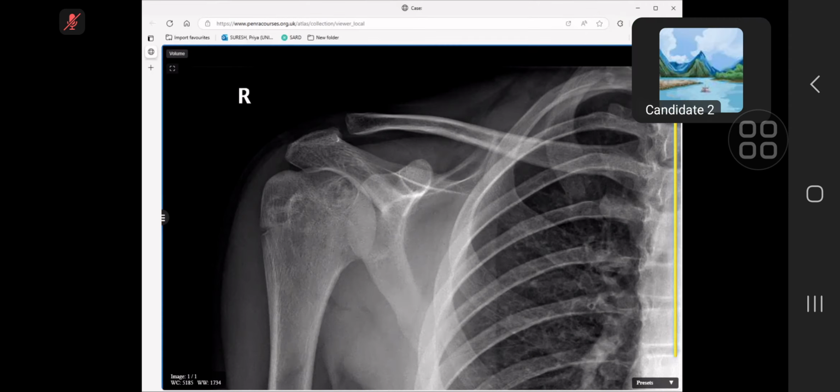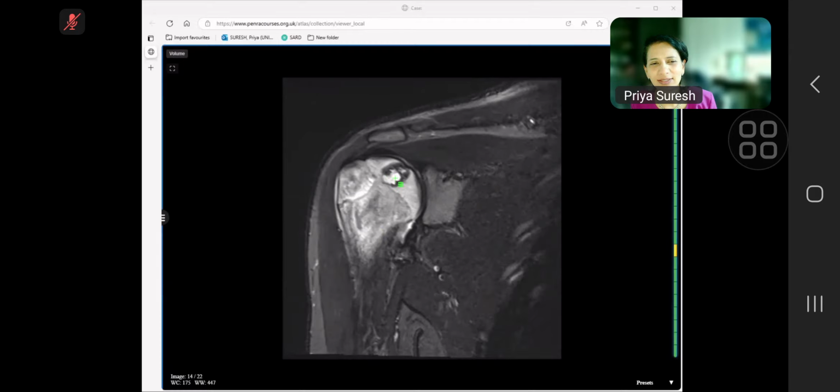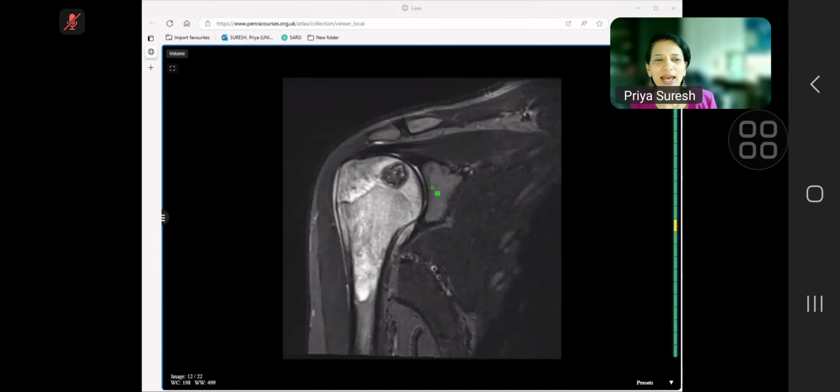pediatric patient, and you picked it up very nicely on the MR. I mean, you immediately said, "Oh yeah, it's chondroid tissue. There's calcifications there," and two things.